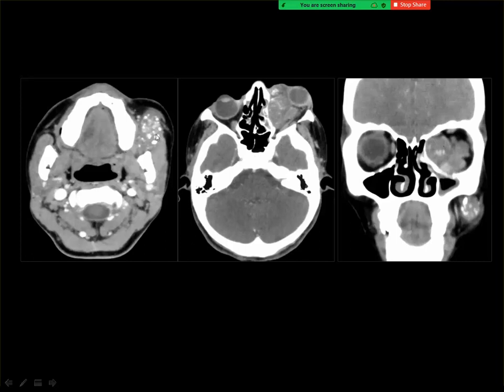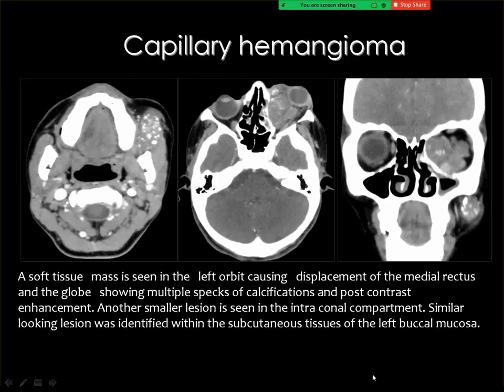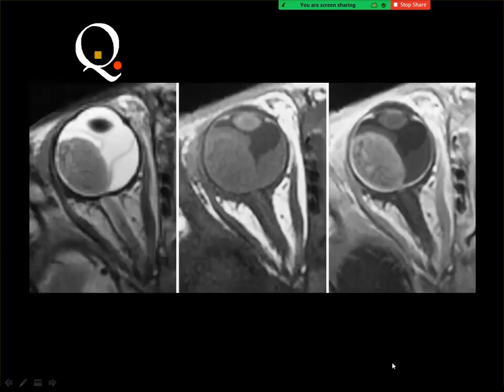And this type of hemangioma is known as the capillary type of hemangioma, which is creeping inside the orbit, inside the infratemporal fossa, and the presence of calcified phleboliths is a good diagnostic landmark for this type of capillary hemangioma. Of course, you know that cavernous hemangioma is a localized intraorbital, well-defined, homogeneously enhanced lesion that may contain also phleboliths.